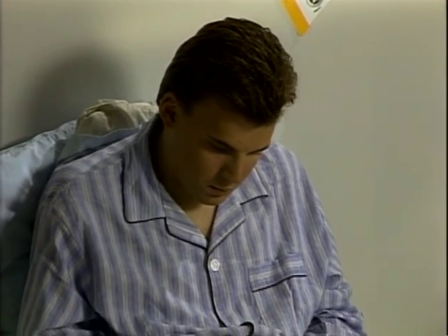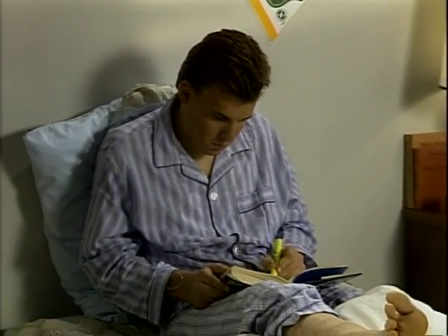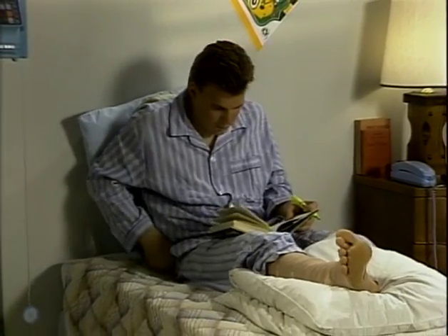John is working hard to keep up with his high school classes. We'll let him study now as we meet another patient and discuss the second type of nutritional therapy performed with a pump in the home.